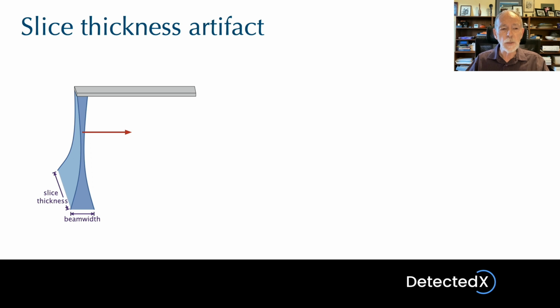Now, imagine the beam being swept from one end to the other of this linear transducer. It will be picking up echoes as it travels, and those echoes will be displayed as a series of lines in the image. The important thing to visualize is that this is going to sweep out a volume of tissue, and the echoes in the image come from that entire volume of tissue.